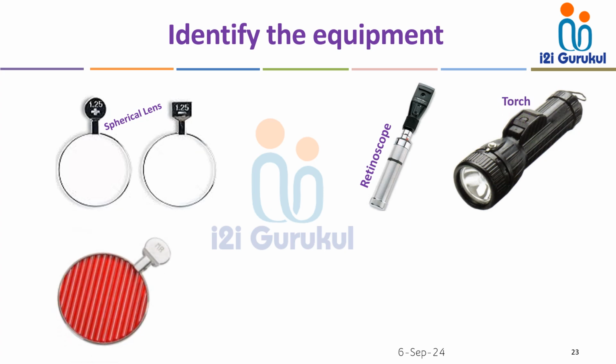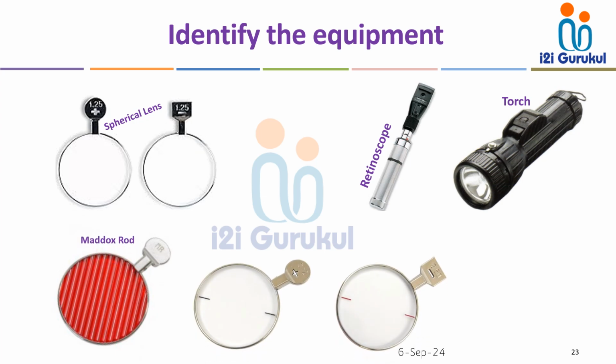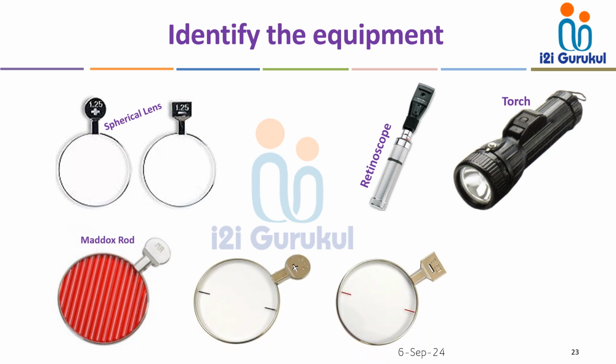And the next one is the Maddox rod. We use this to find out heterophoria or heterotropia. And the second last is the cylindrical lenses. You can see there are markings on the lenses. Those indicate the axis meridian. Perpendicular to the axis meridian there is the power meridian. So in the axis marking meridian there is no power. Perpendicular to this axis marking there is power. So these are the cylindrical lenses.